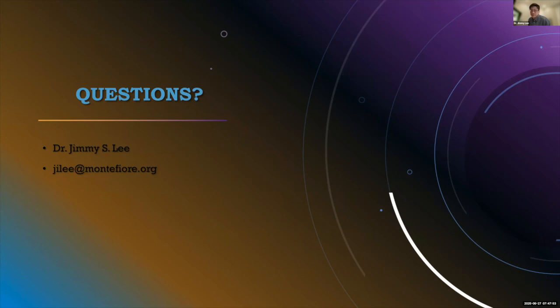I always say 3 things that I'll look for: the posterior globe flattening, optic nerve sheath CSF, tortuosity. If you don't have a good sequence because a dedicated orbit was not ordered, look for a partially empty sella. But partially empty sella is very common by itself, so you can't just call that. You have to put it together.